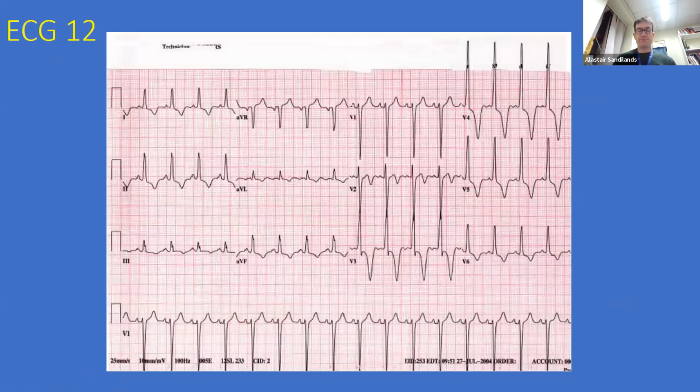And then lastly, I'm just going to give you the answer to this, another example of left ventricular hypertrophy and T wave changes. We've got no ST elevation, but very deep anterolateral, almost global T wave inversion. There's very likely to be structural heart disease, such as hypertrophic cardiomyopathy, possibly aortic stenosis, or high blood pressure that's sustained for a long time. Again, there's a very deep S wave in V1, and a big R wave in V5, over 35 millimeters, and even in V4 you can see a very tall R wave with associated repolarization abnormalities, which is T wave inversion.